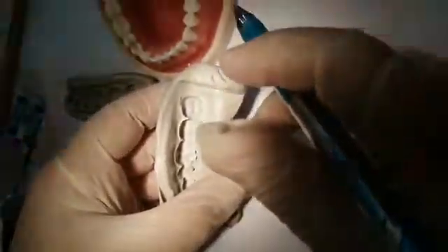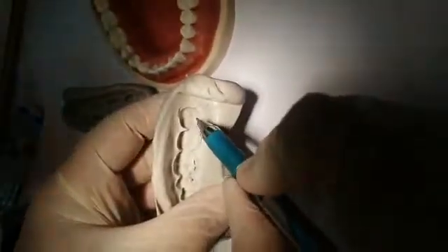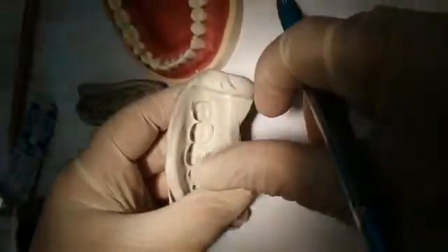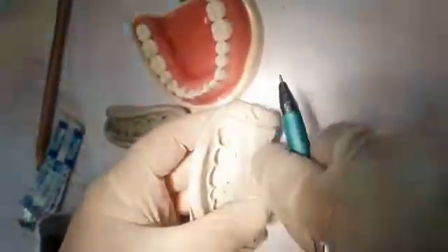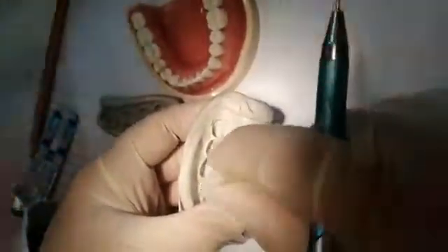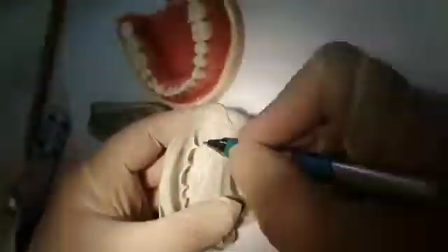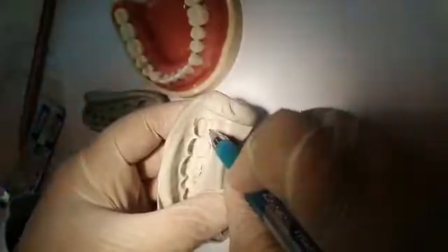Another reason is not enough material, or exerting quick pressure, and the material was partially set outside the mouth. I mixed it, I was slow in my mixing, I put it in the tray, and I was going in while the material had already begun the setting reaction. That means part of it has already been solidifying. Although I see it as flowable, or playable with my hands, some of its flow has actually been reduced because some of it has accumulated and aggregated in the polymerization reaction. So it has already become partially solid. It will drag, it will not flow.